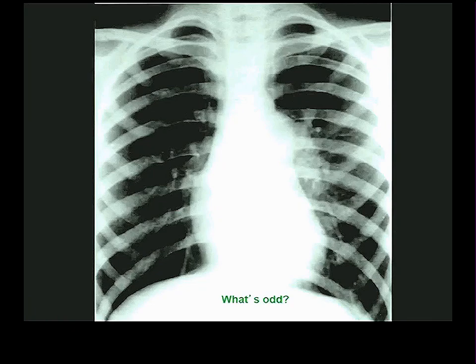What you said coming from the right atrium? You mean... Yes, thank you. No, thank you. See, Dr. Larson did what everybody should have done, which is correct me. All right? Coming out of the right ventricle. Not only should you all correct me when I make mistakes, but if you have any questions, now that I'm in no rush today, you interrupt me to ask questions. Go ahead. That area of opacity lateral to the pulmonary trunk, is that a normal finding? Yeah, that's just normal vasculature of the left lung.